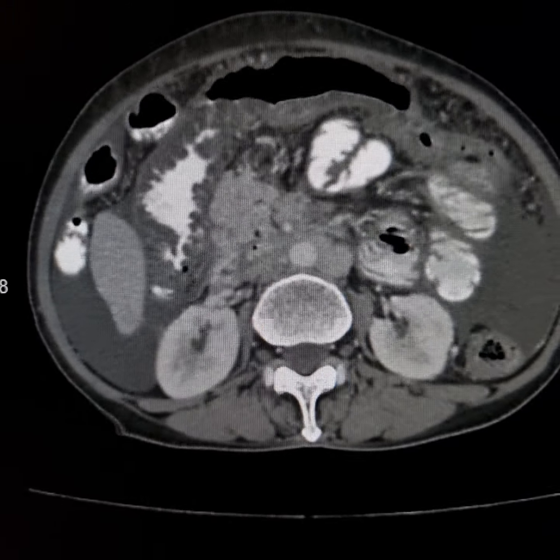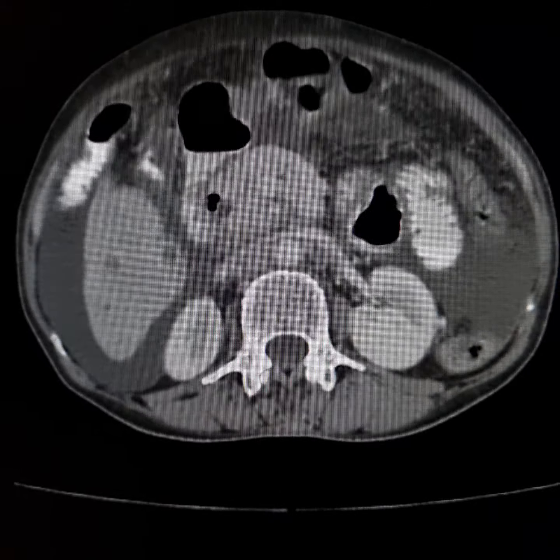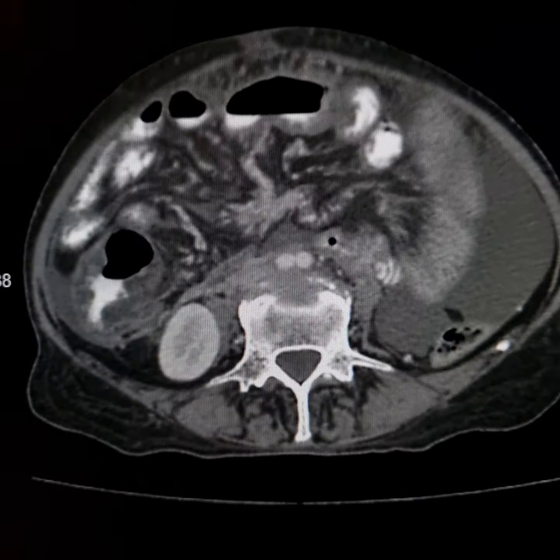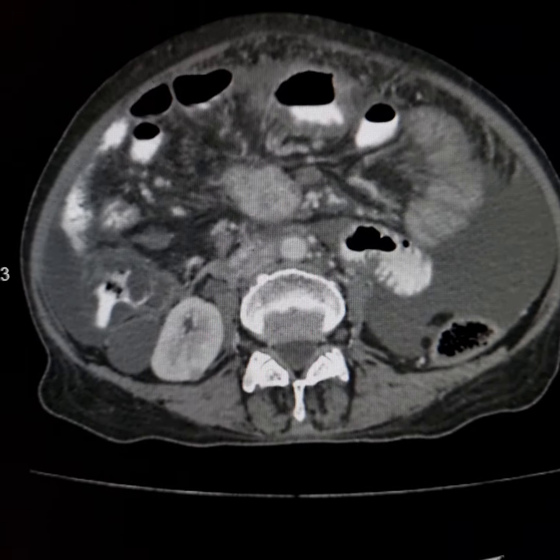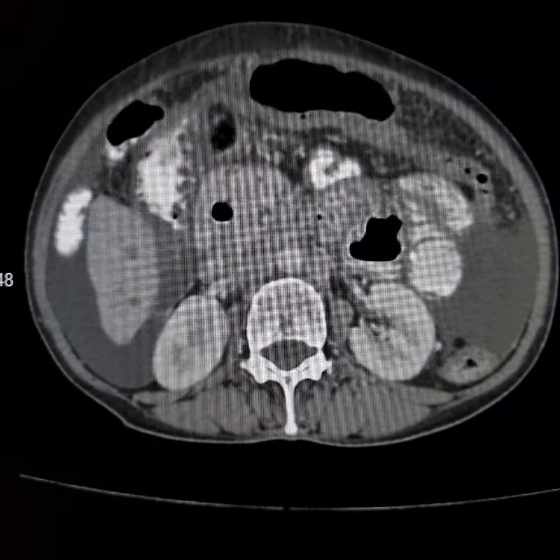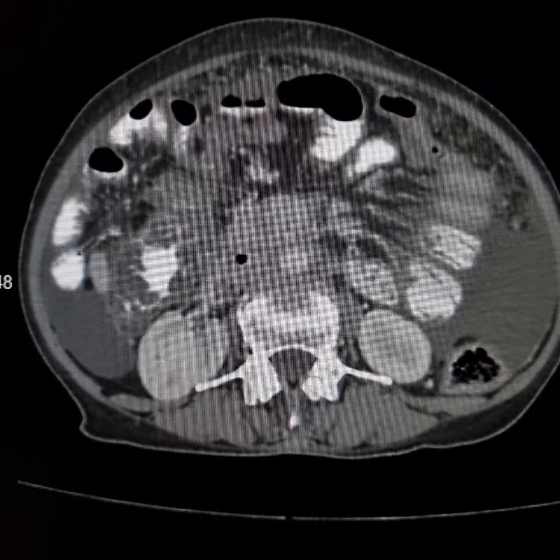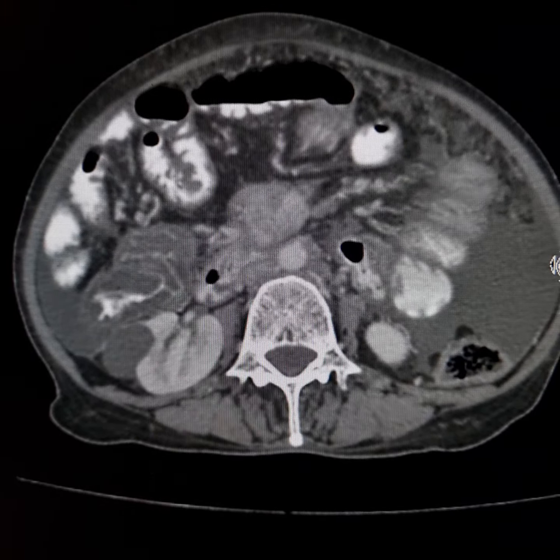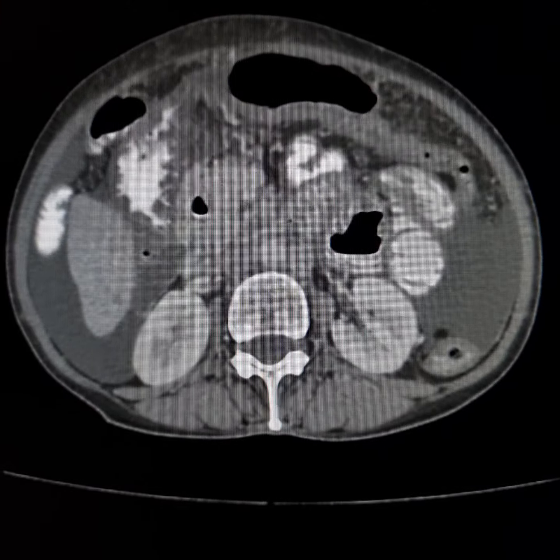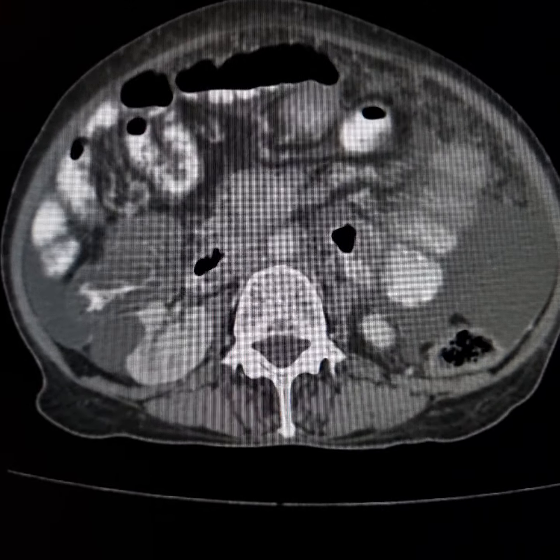So the ischemia has involved not only the jejunum and ileum, but also the cecum, ascending colon and right half of the transverse colon, typically in the distribution of the superior mesenteric artery. The occlusion of the superior mesenteric vein also contributes to the findings.